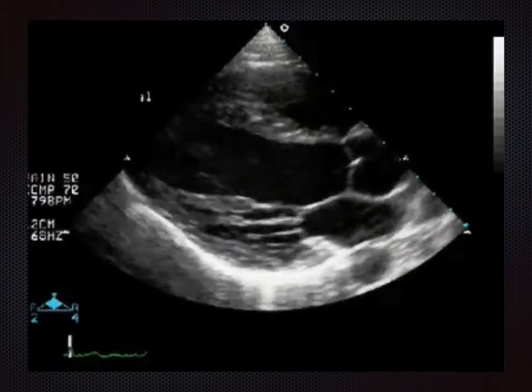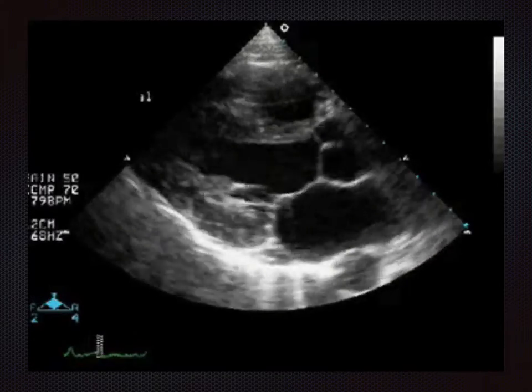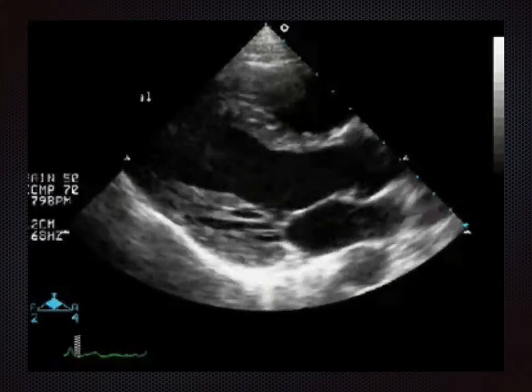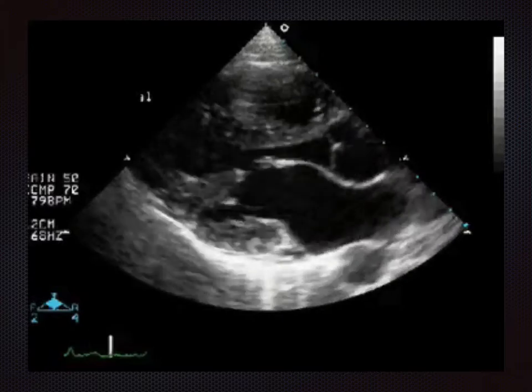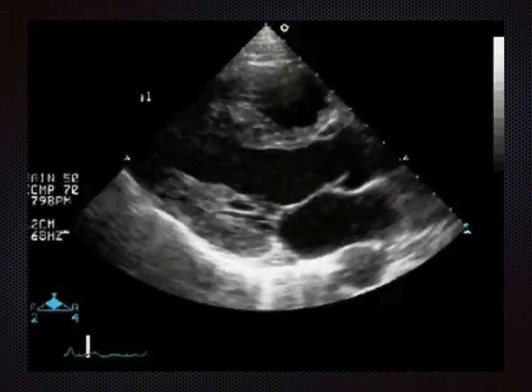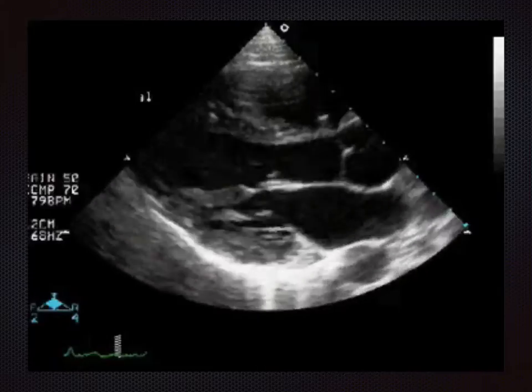If you're really interested, the way the mitral valve opens and closes is called the EPSS, the E-point septal separation. But I expect you'll remember that for at least 5 seconds before it completely loses memory. But you don't need to know its name, you just need to look at it and say, does that happen?